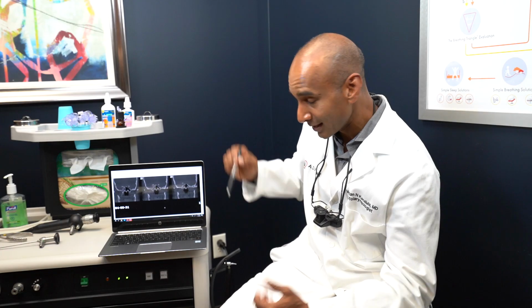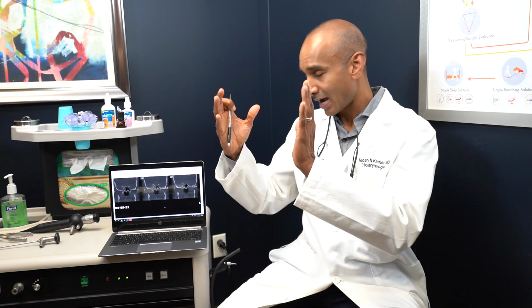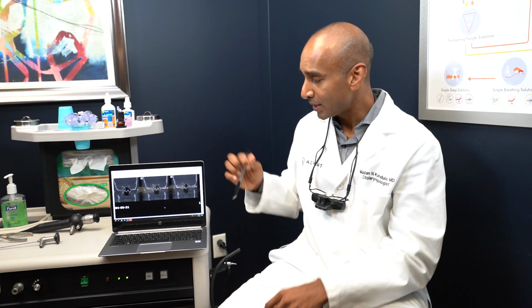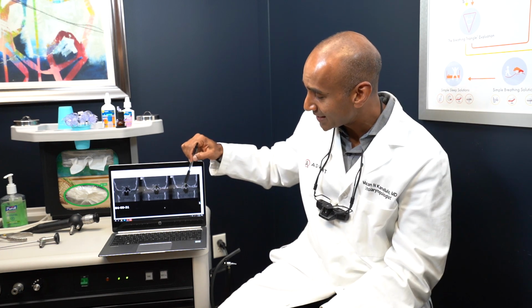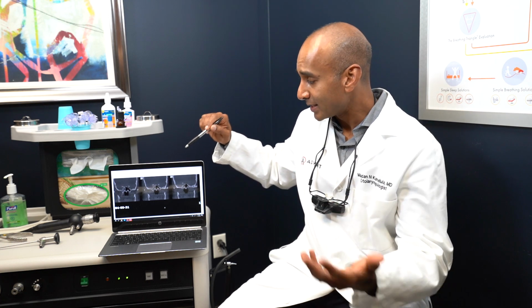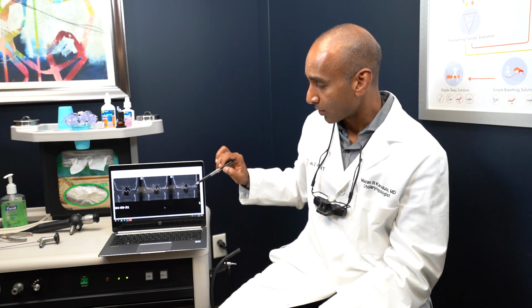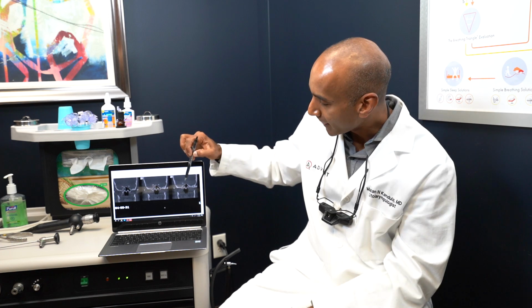And so that is a CT scan of the sinuses. It lets us see back to front, top to bottom, inside. You can't see any of these areas. We can't see into these sinus areas without imaging. So if we're trying to diagnose somebody with either tight sinuses or sinus inflammation, the only way to do that, if it's a chronic issue, is with this. X-ray imaging, CT or CAT scan imaging, that is what we're seeing, and that's why it's so important.